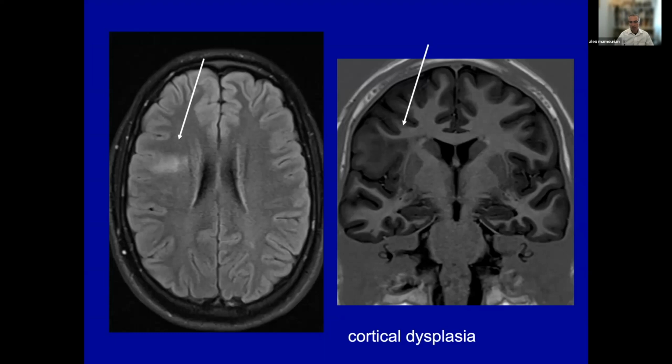These can be confused with low-grade neoplasms, and there is some overlapping appearance. Sometimes you need follow-up and some advanced imaging, if possible, to sort it out. A good example here of what I'm talking about: as part of your imaging sequence, you want to have a high resolution technique, like this is MP-RAGE, where you can see very clearly the white matter, the cortical ribbon of the brain.